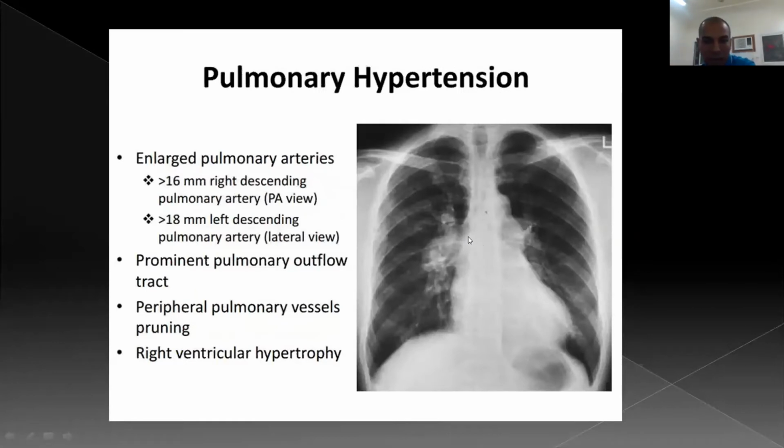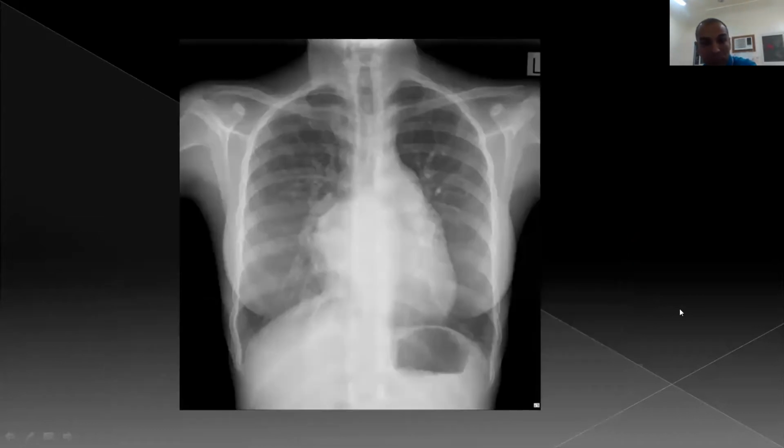Again, how can we identify dilated pulmonary arteries? This one is the left side, dilated, and this is the right side. It's dilated, but it maintains the bifurcation at the hilum. So it's not a hilar mass, because this one is bifurcating and this one is also bifurcating. So we have here a dilated pulmonary artery. It's straightforward with pulmonary hypertension. This is a classic form of what we call mitralization of the heart.